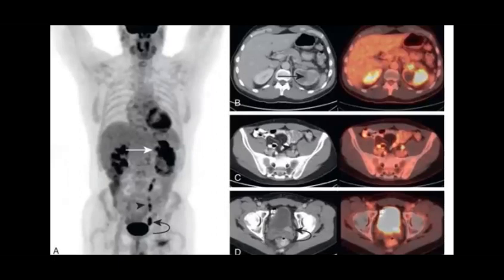When you try to read it in the textbook, you will find that, yeah, I want one very good term. I want you to mention. Look in the ureter here. What happened here? Yes, synchronous transitional cell carcinoma will be one of the good things to mention here.